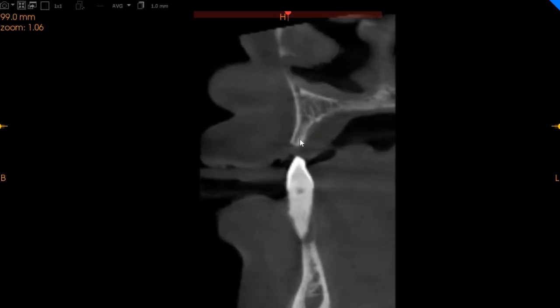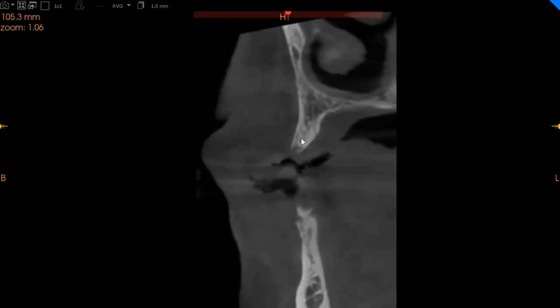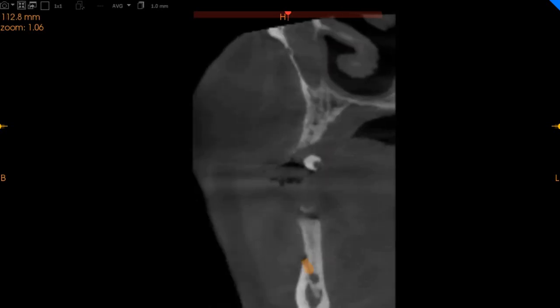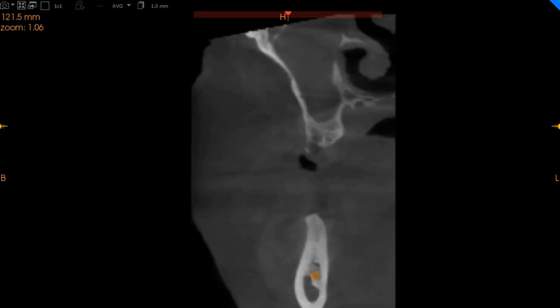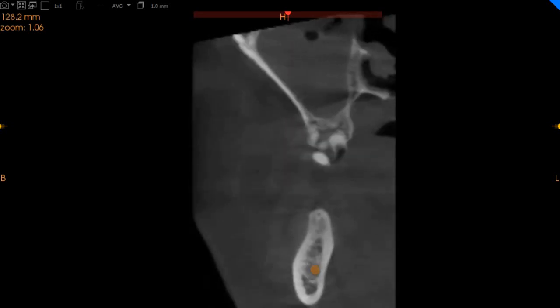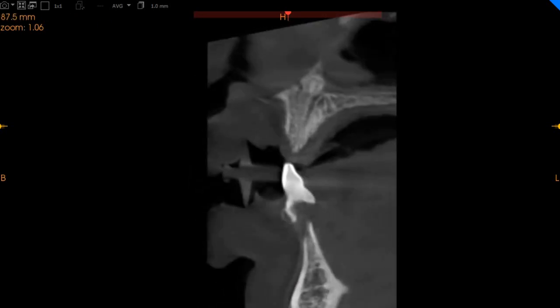In the lateral incisor region, again very thin bone available here. Canine region, we've got slight bit of bone, 4 millimeters of width with 12 millimeters of height. And when we move towards the premolar region, we've got slight bit of bone here, 6.5 millimeters of width with 8.4 millimeters of height. So if there has to be implant placement, it should be in the central incisor region and in the premolar region in the upper jaw. The molar region does not have sufficient bone.